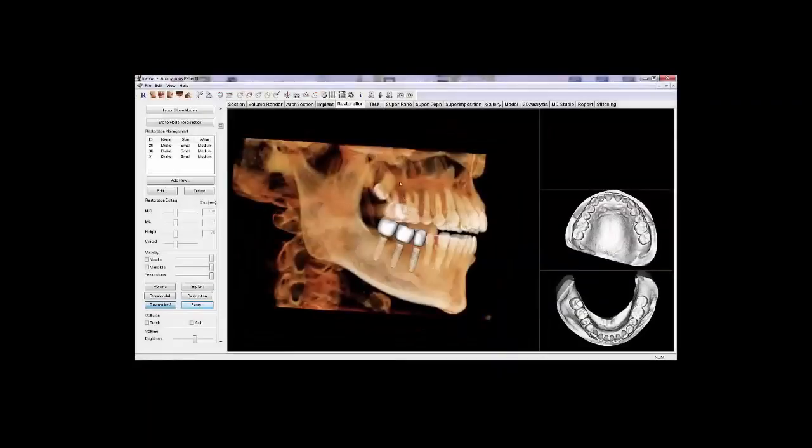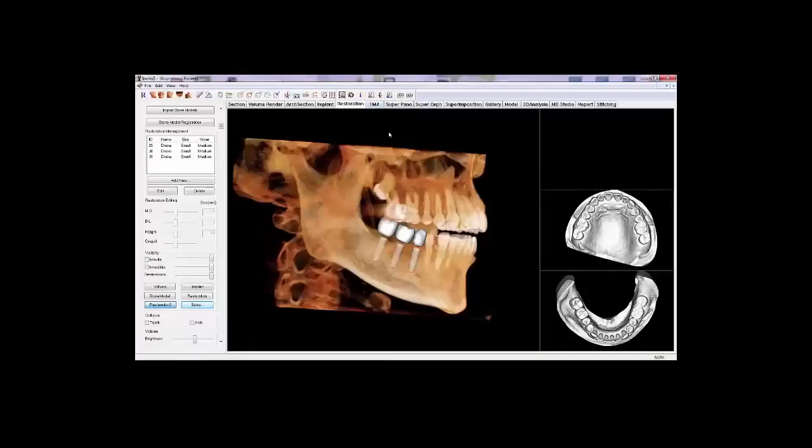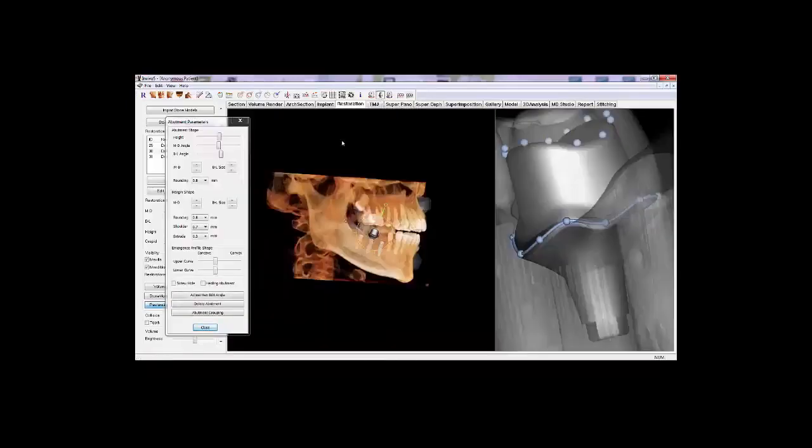The next new feature is the Custom Abutment tool. You must have an implant and restoration placed to use this tool. Select your restoration, then click on the tool, and the software will build an abutment. In the pop-up box, you can edit the abutment parameters such as height, angles, size, and rounding. You can also edit the parameters for the margin here.